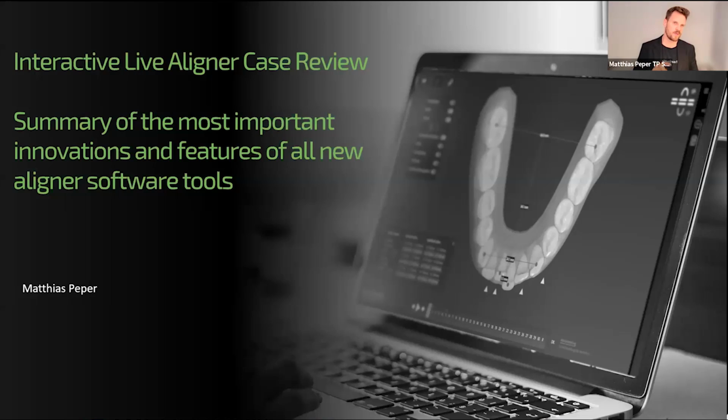We will do it for Invisalign, for Angel Aligner, and for Spark. As you already know, we do treatment planning for all these different systems, and we realized that for every system, there are pros and cons. There are different ideas of what you can do.